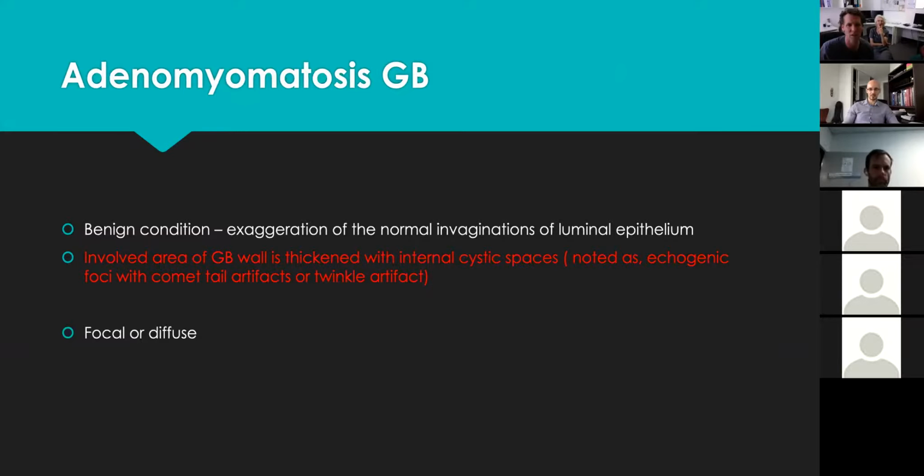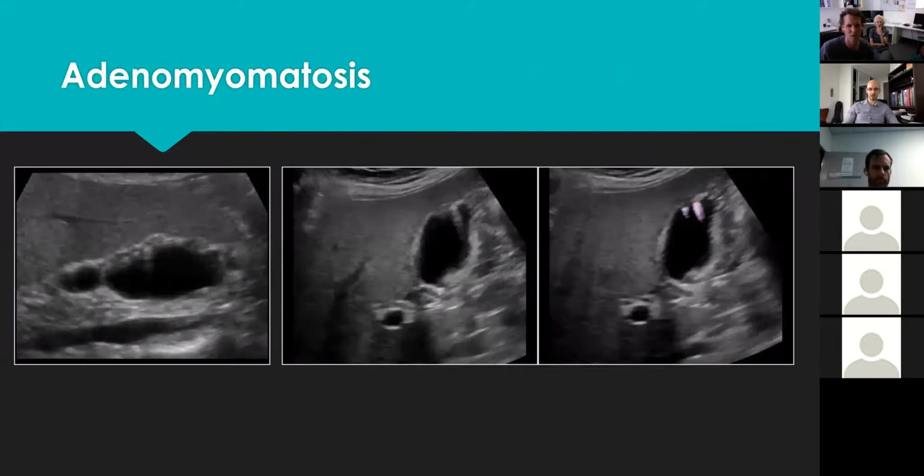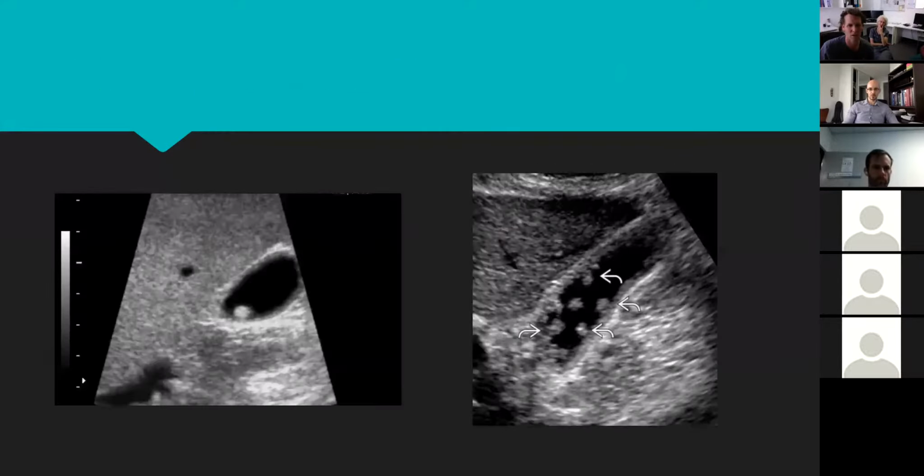Well, I might ask this, and just one thing that I think probably you would need to know, the polyps, as you can see, they are very hyperechoic things, usually round, usually small. They usually don't cast a shadow. They are very common and very commonly mistaken for gallstones.